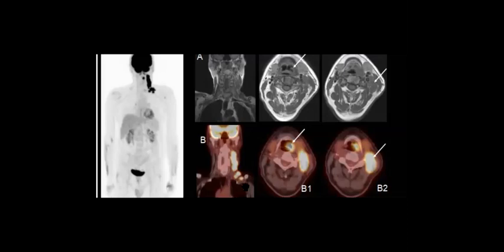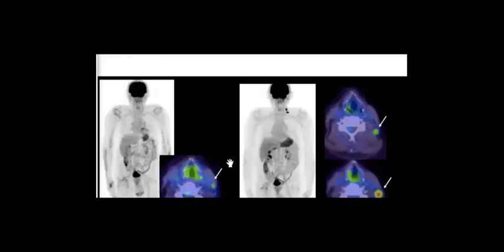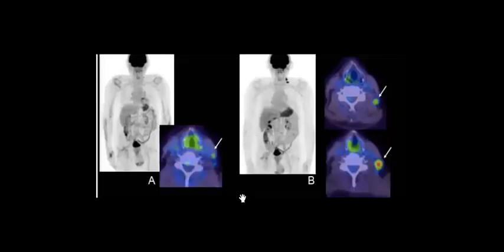And they like to mention the supraclavicular as a special entity. So they also involve the left supraclavicular lymph nodes as well. Yes, you can see them. Okay. What about this case?